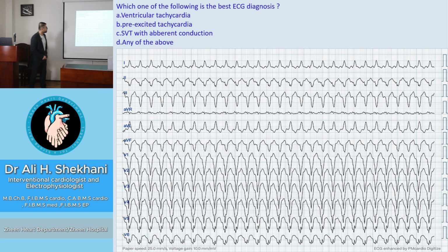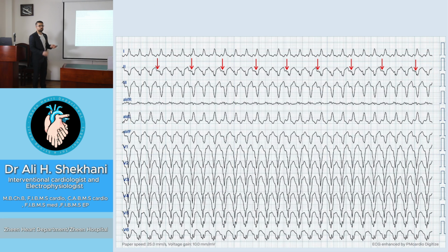What about this ECG? It is a regular wide complex tachycardia. I selected the leads with small amplitude to look for the P wave. There is some AV dissociation, and besides the AV dissociation there is also a QS pattern in V5, V6 and negative concordance. So it goes with VT easily. Whenever you have negative concordance, or a QS pattern in V5, V6, don't hesitate. This is VT. And at the same time, look for the AV dissociation.